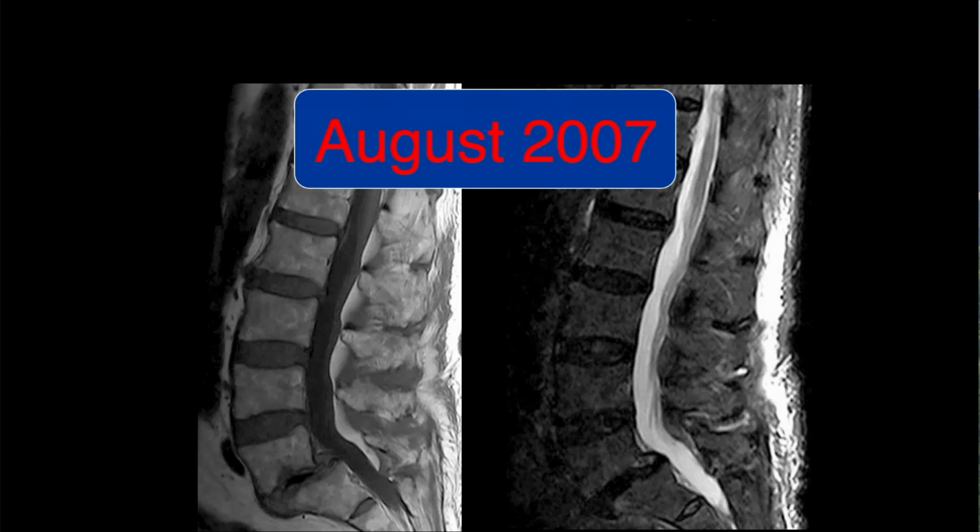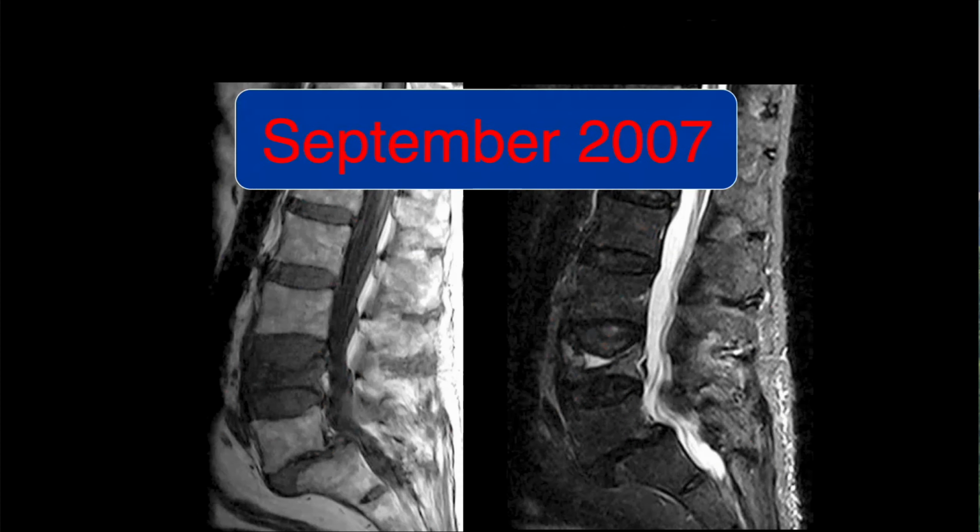Okay, Robert. All right, August 2007. So it looks like we have some anterolisthesis of L5 on S1. Don't see an acute traumatic abnormality otherwise. So I just want you to look at the L4 vertebral body. So this is August, and actually this was imaged because the patient was having back pain after a fall. And then the back pain got worse a month later. And this is what it looked like a month later without any history of trauma between the two.